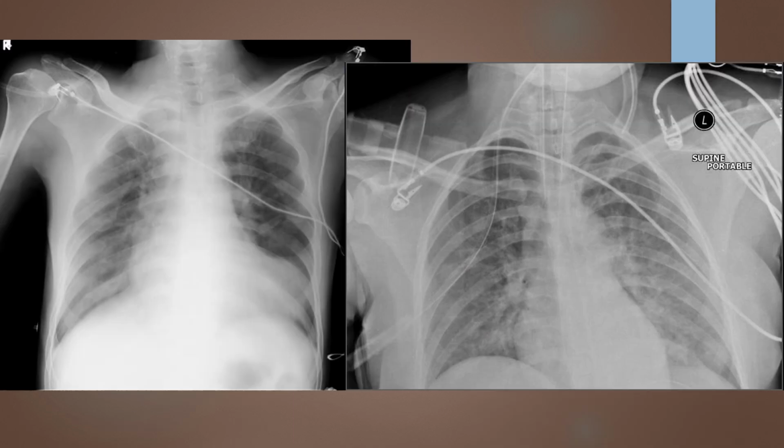So let's practice a couple here really quick. So number 1, we're going to go over the non-negotiables. So first of all is all the anatomy here. I'm going to take a quick look at all of my global view, and I have tops of my apices all the way down to the costophrenic angles, so I feel like all the anatomy is there.